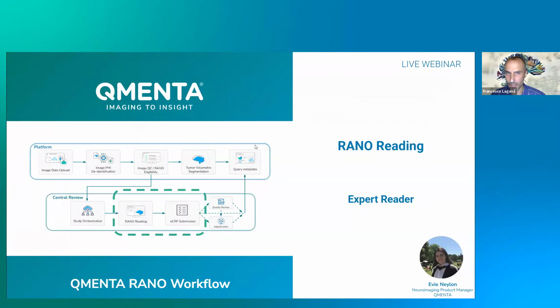Now that the tasks are created, we are all set for our research to start doing the work that really impacts your trial, to see what the reader experience is when they execute a RANO longitudinal assessment. I'll hand over to Evie.